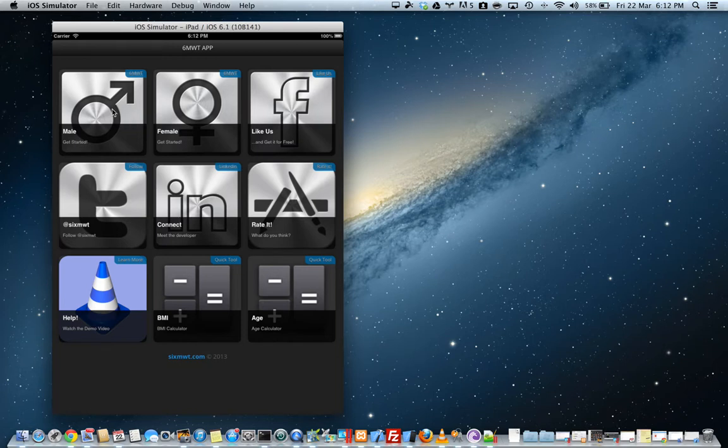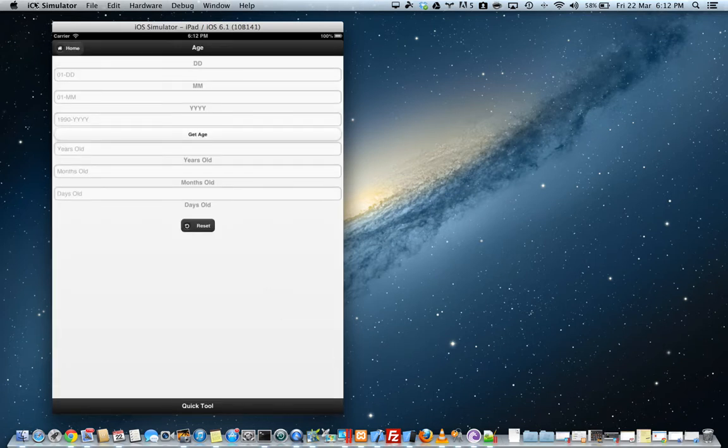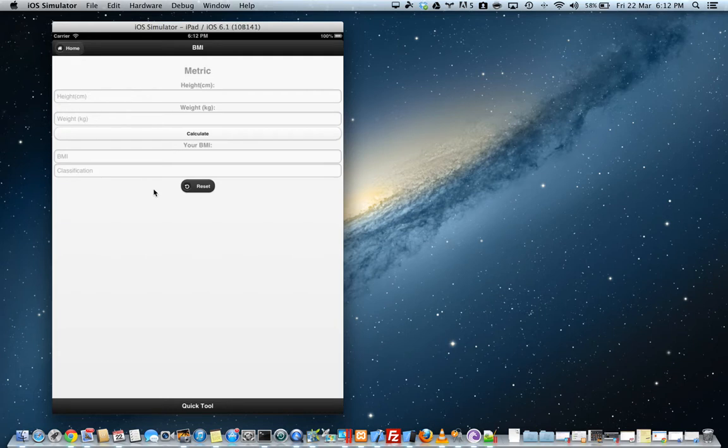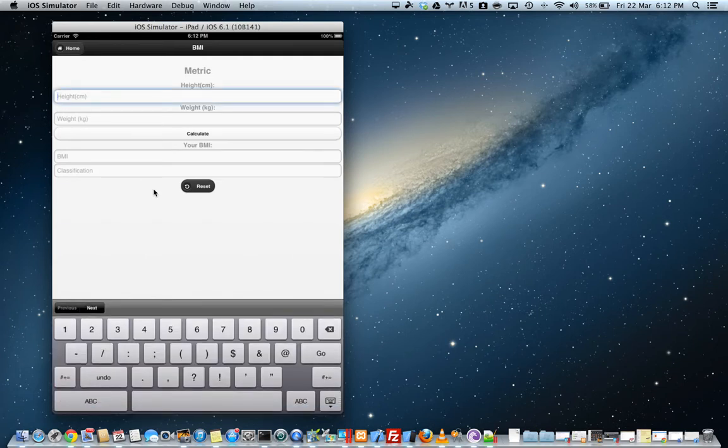So you've got your male client, your female client, Facebook, Twitter, LinkedIn, a link there to rate it, and this demo video should be in there once it's all done. Your BMI and age calculators, so they'll come up there as well, and your BMI calculator. Just show you a quick demo of that.